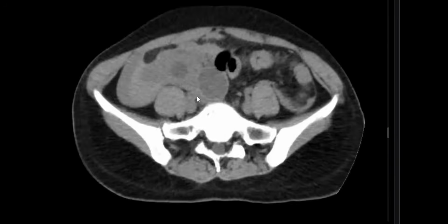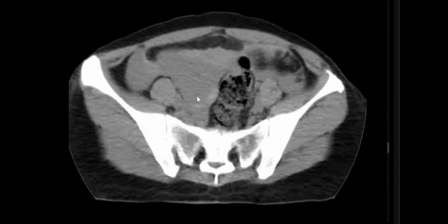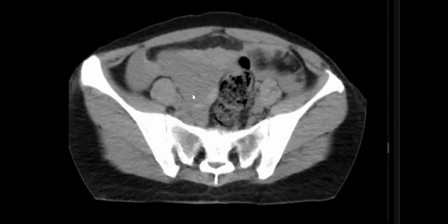Usually in acute pelvic pain, we do a contrast. What is the value of a non-contrast study? To check the density. Pre-contrast, yes. And then with the post-contrast, if there is any new hyperdensities. Very good.